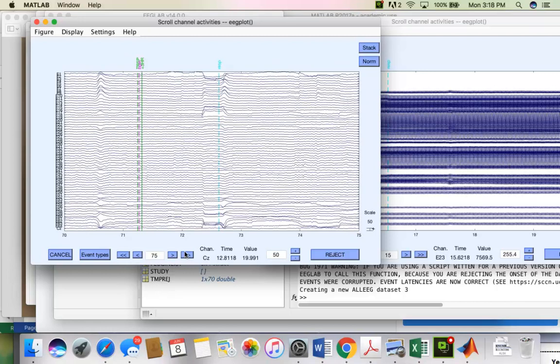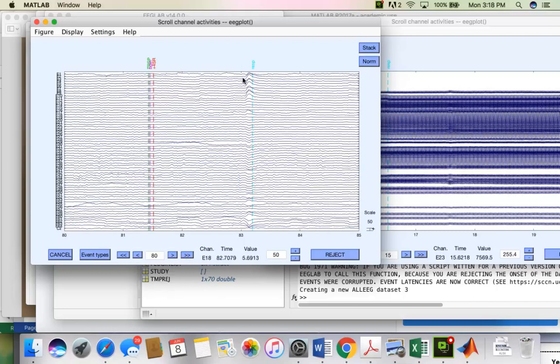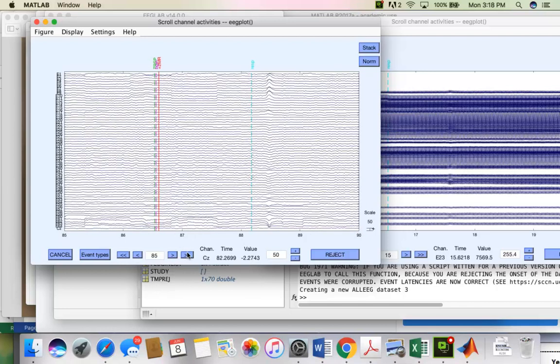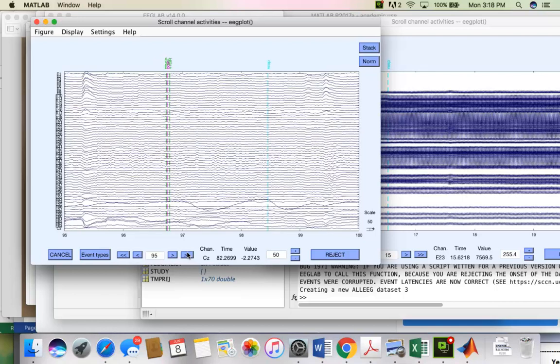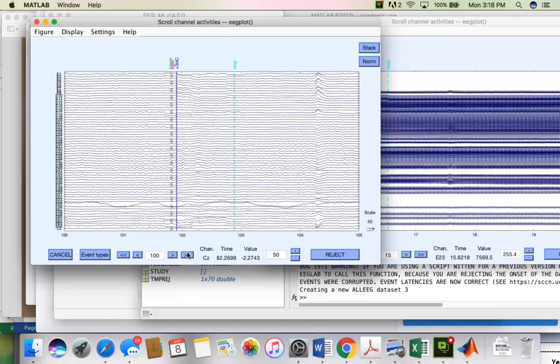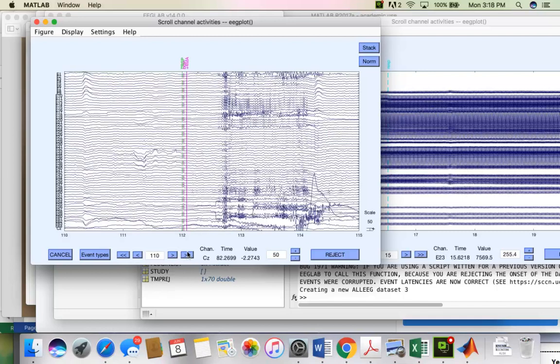So that was actually the only one so far that I've seen. All of these, you see how this kind of thing is a pretty predictable shape. It's repeated across multiple channels. Our independent component analysis algorithm to delete artifacts is going to do a pretty good job getting rid of those. So I'm not seeing any horrible ones. Okay, here's another one. You can see this region, say here to here. That's pretty bad, so that one I could live with throwing away.